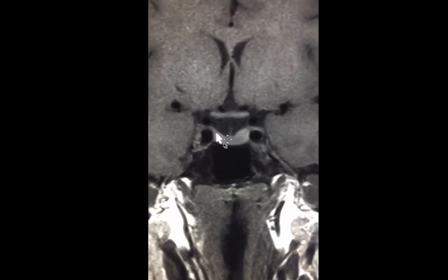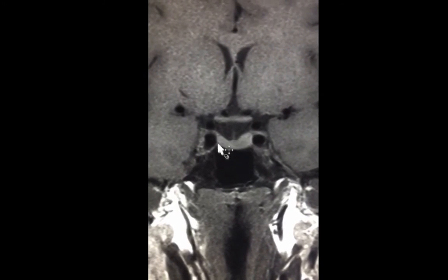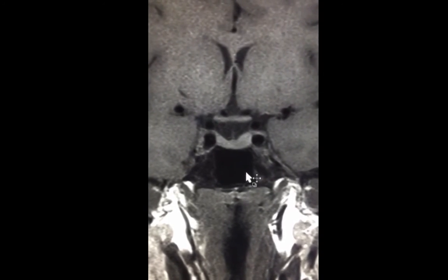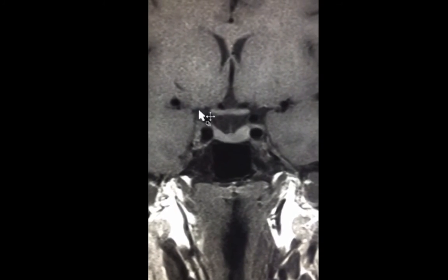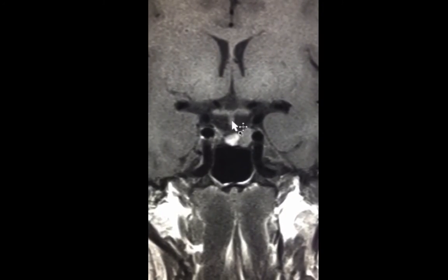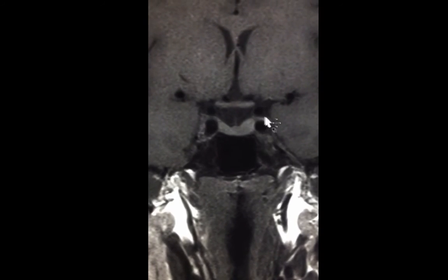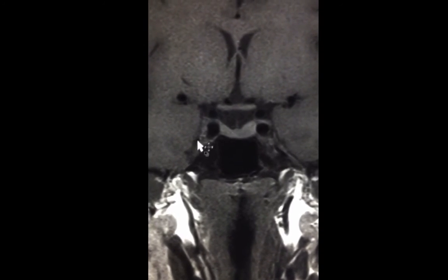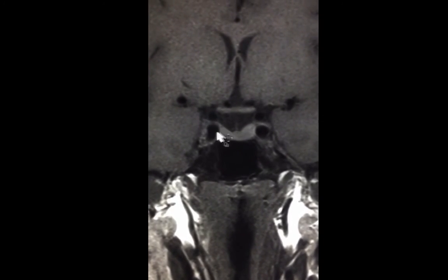image. This here is the pituitary gland living within the sella turcica, just above the black area representing the sphenoid sinus. The CSF containing space above the pituitary gland is called the suprasellar cistern, and it contains the pituitary stalk, the linear thing here. There is a cavernous sinus on each side of the pituitary gland. Within this sinus, there is the internal carotid artery, the dark circles.